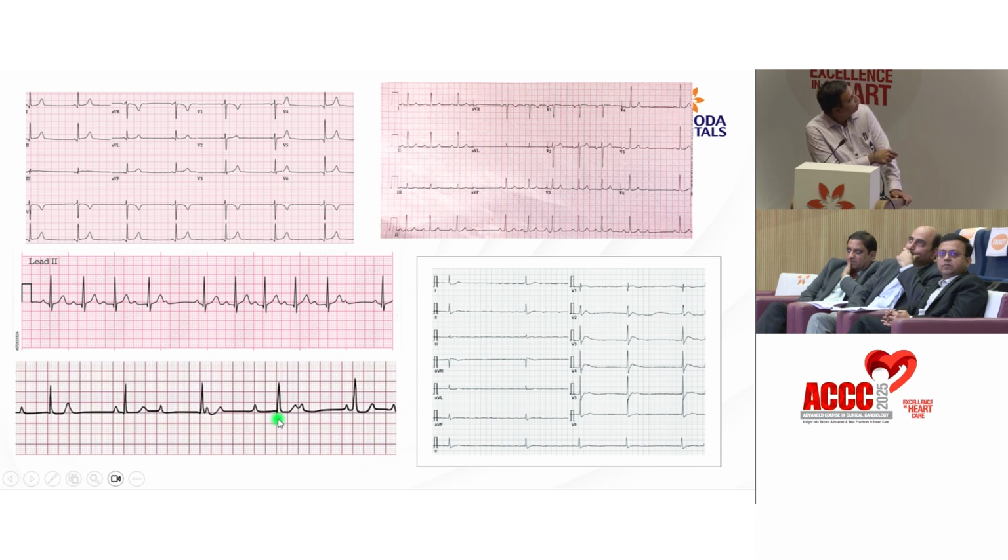We see the above ECG. This is showing a P-QRS relationship is constant, but suddenly there is a block. So this is a Mobitz type 2 block. An irregular heart rate will be there in these cases. And the below one is an AF with a slow ventricular rate. So this is what I was talking about when we were classifying bradyarrhythmias.